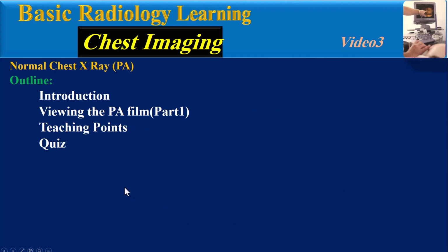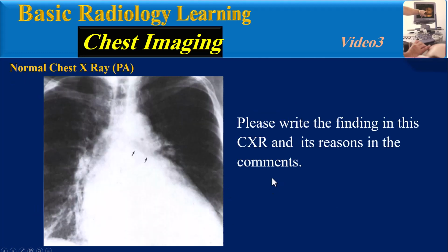Now, a final quiz. Please write the finding in this chest X-ray and its reasons in the comments.